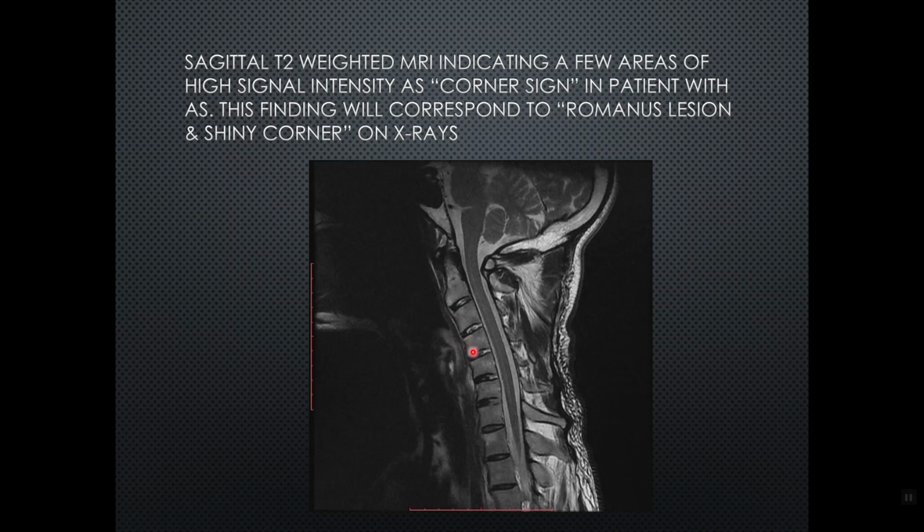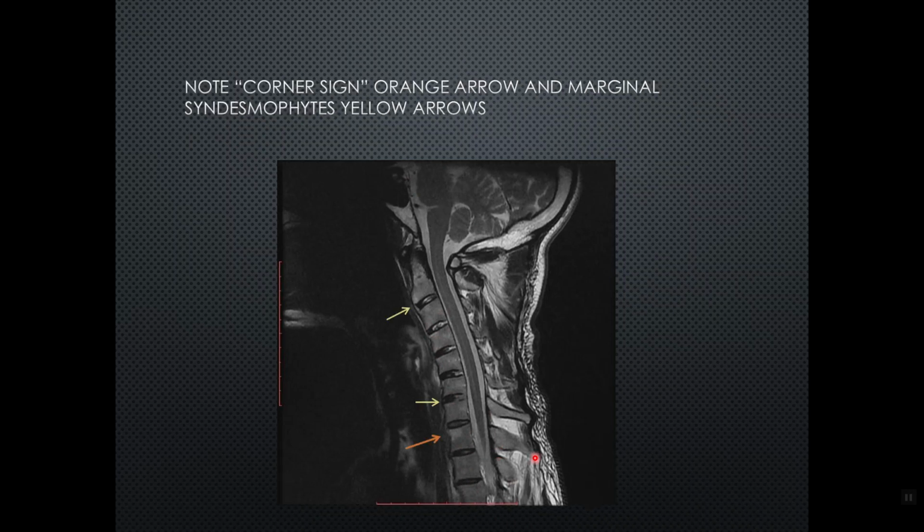So you look for those things in MR imaging, because when X-ray is unrewarding or less informative, for instance, for diagnosis of spondyloarthropathy, that's when MR imaging can be quite helpful for you to narrow down that diagnosis, and that would be significant features for ankylosing spondylitis. Fortunately, the spinal medulla seems to be unaffected by this process at this point. So please, review it.